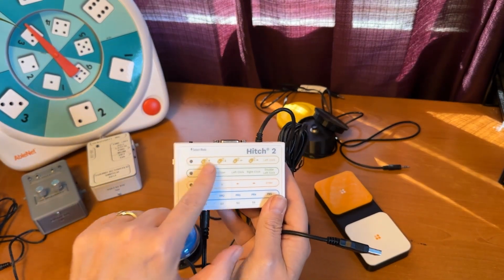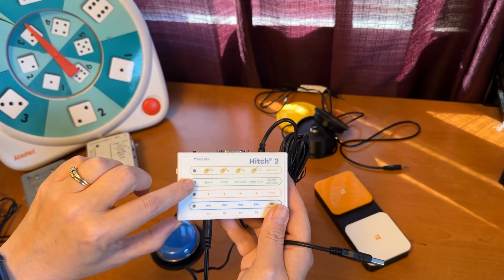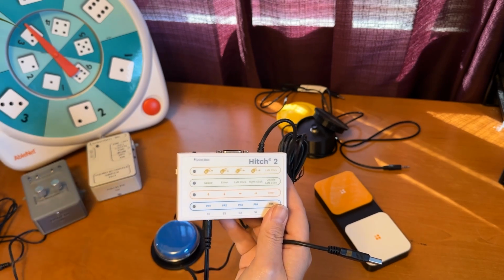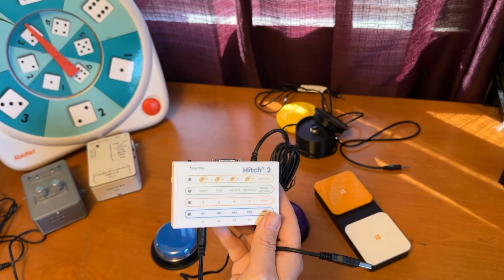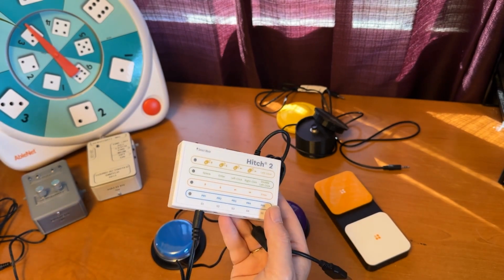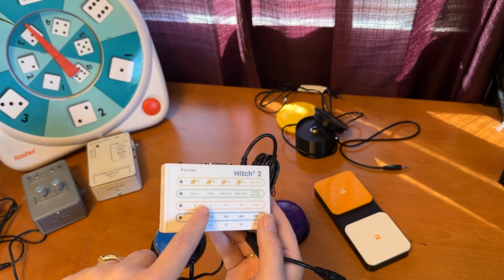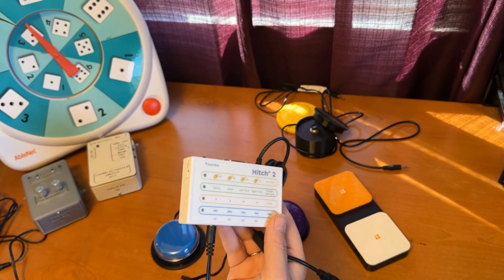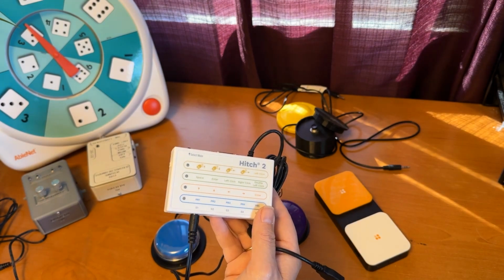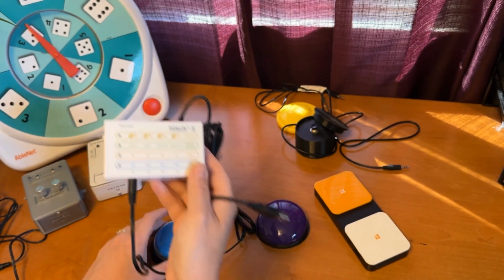And now depending on which mode you pick, this could become your up arrow or your space bar or your mouse movement up, or you can set a custom combination here. So again, you could plug in up to 5 different switches. There's some preset things that will happen or some customizable options. And this allows this switch to become these functions on your computer. So again, using a switch to access a computer.